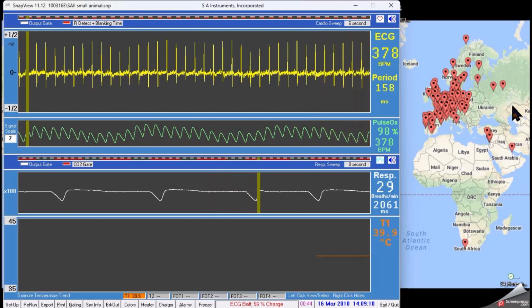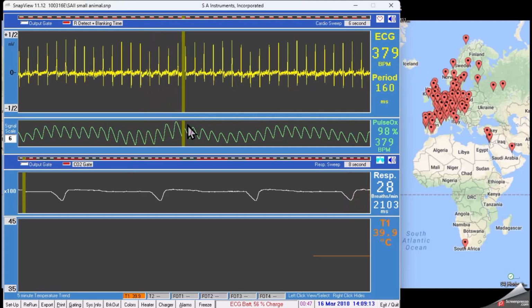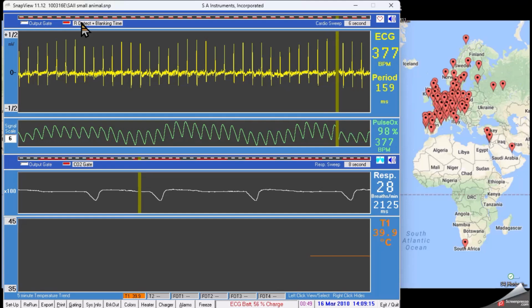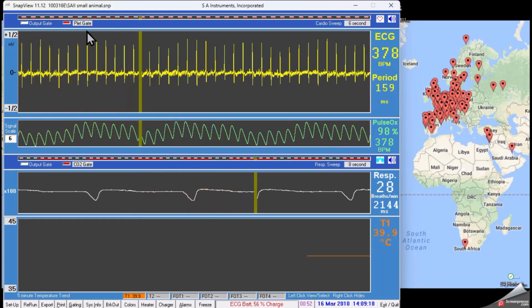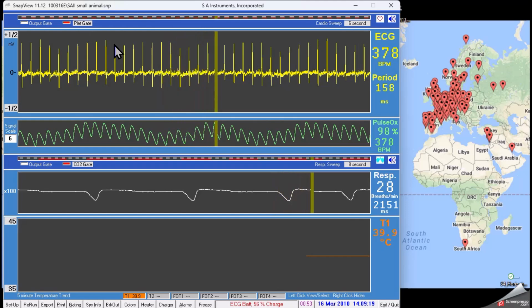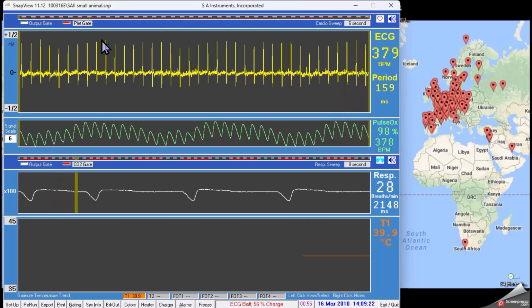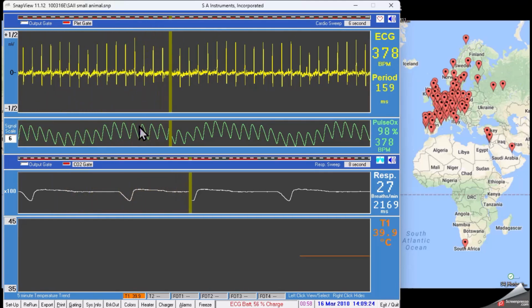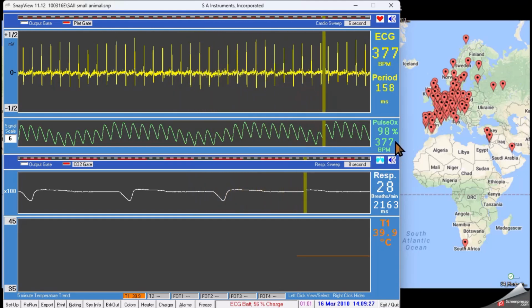The peak of the plethysmogram waveform is also automatically detected by the system. The indication that the peak was detected can be displayed in the cardiac sweep display. Right or left click in the region to the right of the red icon to select Plet Gate. Note that a red bar is displayed above the peak of the plethysmogram waveform. Both heart rate and oxygen saturation are calculated and displayed.